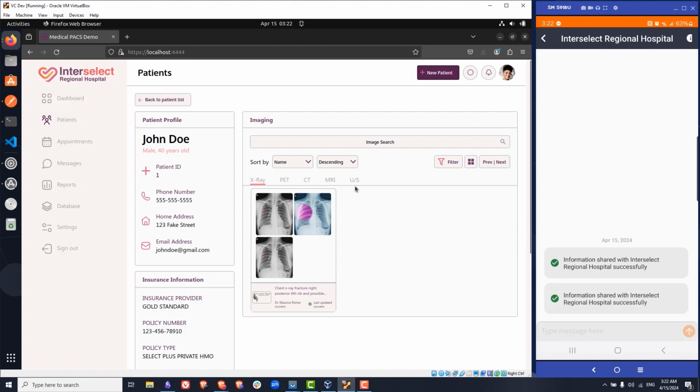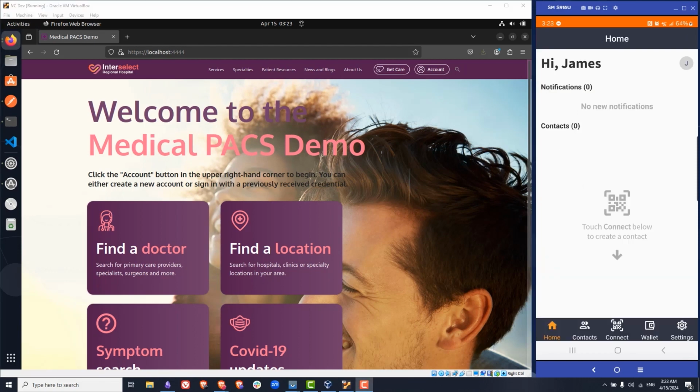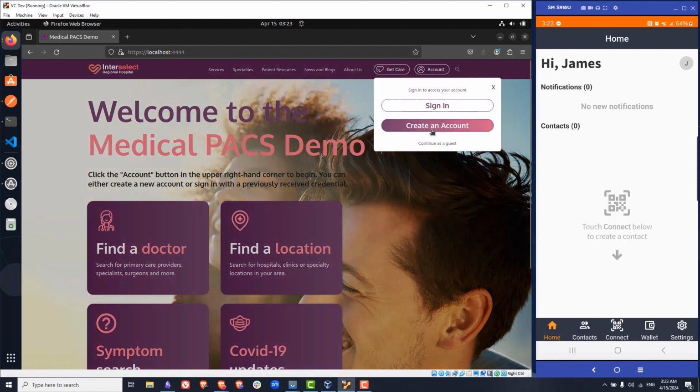So what we're going to do now is do the process again with an account or an employee that has fewer permissions. So I will sign out here, and then off screen I'll reset my wallet. Okay, so now you can see I've reset my wallet. You don't have to watch the process of reconfiguring it. It's not super entertaining or exciting. But now my name in the app is no longer Mike. It's going to be James, and we'll go through the same steps as before.